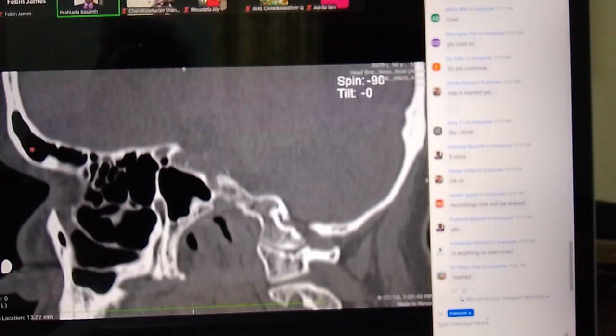This is the frontal sinus, an extensive frontal sinus. This is the medial wall of the opposite maxillary sinus. So we are almost nearing the opposite maxillary sinus medial wall. The sphenoid sinus, this is the optic nerve. This is the fossa of Rosenmuller.